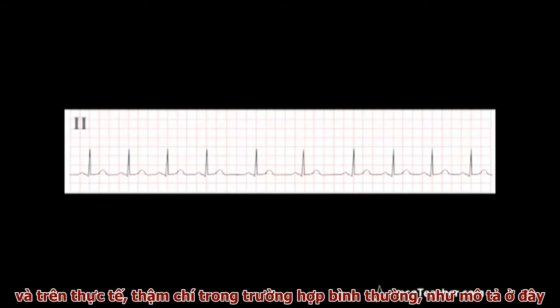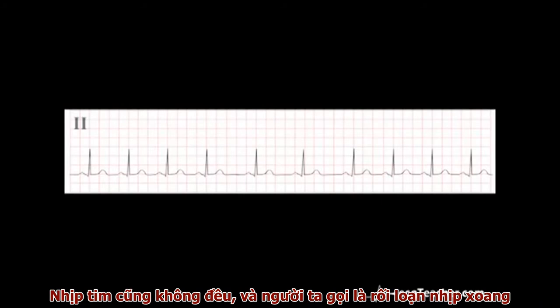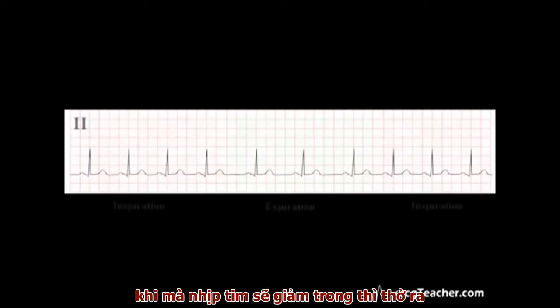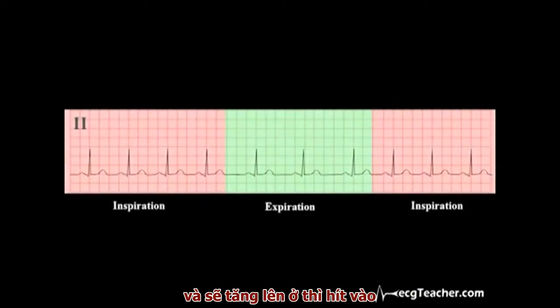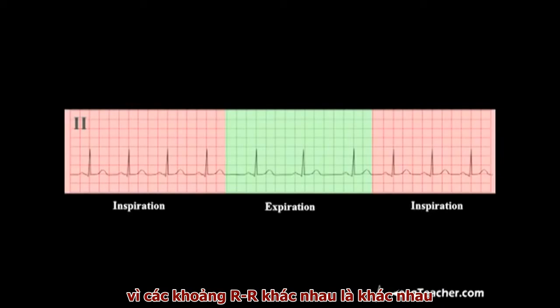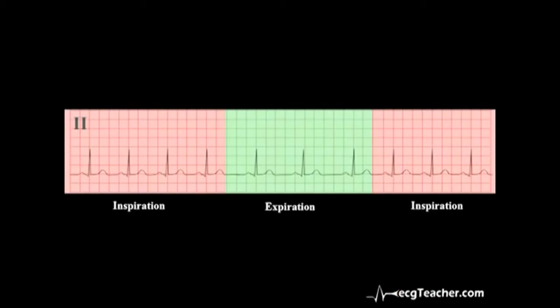And in fact, in many normal hearts, as illustrated here, the heart rate is somewhat irregular due to a phenomenon termed sinus arrhythmia. You will remember from physiology that this is a completely normal variant, with the heart rate slowing during expiration and speeding up during inspiration. We cannot use the RR interval technique to calculate heart rate in this case, as the RR interval varies.